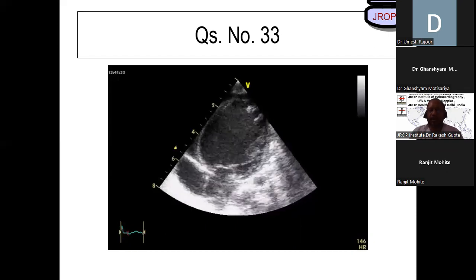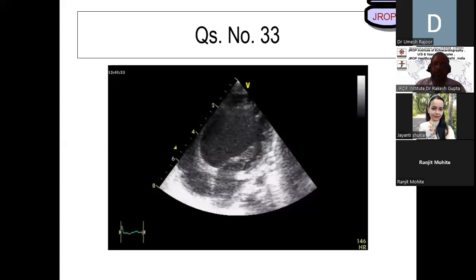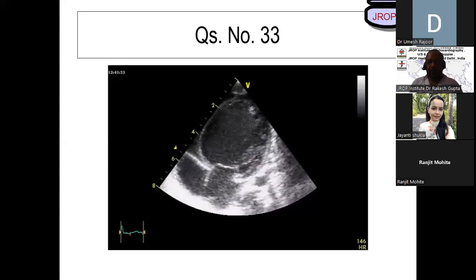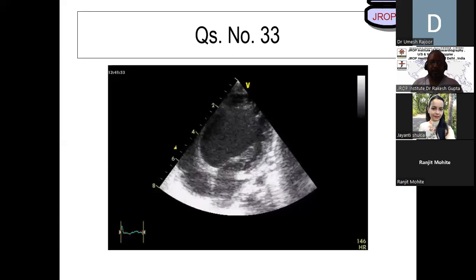Anything you see abnormal in this patient? LV is dilated. Great. I got one number. Tell me more. RV is very small in size. What else? A newborn born with this disease.